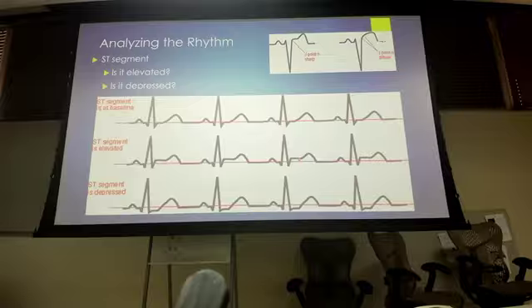But if we only looked at lead 2, we may not see that at all. Maybe this is an early infarct. Maybe the patient came in 20 or 30 minutes after chest pain and is now actively infarcting. So we're going to repeat that ECG. If you look only at lead 2, you may not see this because it may be in those lateral leads, maybe in the anterior leads or the septal leads. And then this bottom one would be an indication of ST depression. Again, we're going to do the exact same thing, look up in that main portion of that ECG.